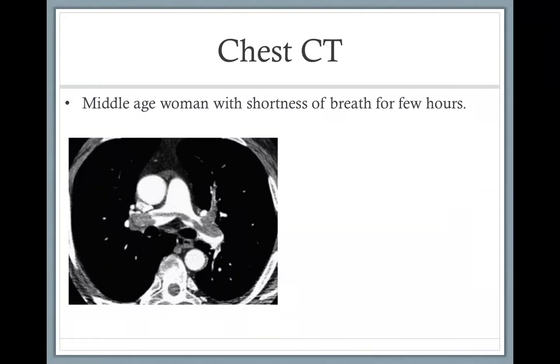It's very unlikely to be able to see abnormality in the lung when you are looking at a soft tissue window. So if I'm showing you a soft tissue window, most likely I'm interested in looking at something in the mediastinum, either the major vessels or the lymph node. It's not normal. So this study is not normal, but I'm not sure if the question is on these or on these white spots, which are actually the blood vessels with contrast in the lung. But again, I'm not here interested in the lung. Otherwise, I would have put lung window, right?